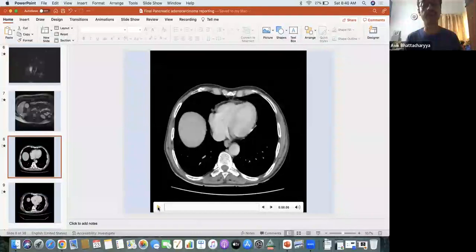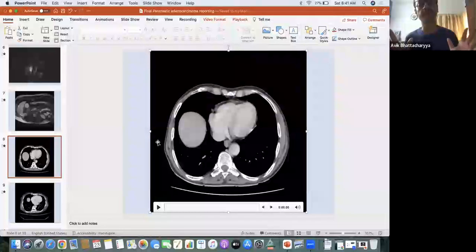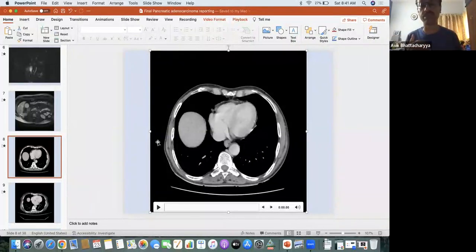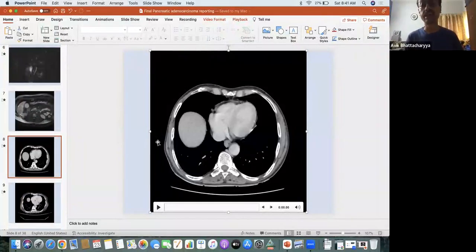So this is my one more case. And when I am going inside the discussions, I first had shown a normal anatomy of upper abdomen where we could see the liver, the intrahepatic vessels, then the normal common bile duct, pancreas. Then we have discussed a lesion which is probably resectable because it is only abutting a small section of superior mesenteric artery and superior mesenteric vein, but otherwise it is normal, if those liver lesions are cholangitic abscess. Here is a different patient, a different lesion.